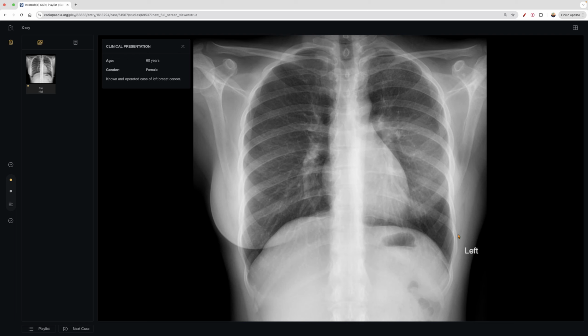We get so caught up looking at the lungs and looking for what we want to look for, our confirmation bias, that we do miss this. And then had you not paid attention to that, or if these people didn't give us the greatest indication here to let us know that there's breast cancer, we wouldn't be able to appreciate the fact that this opacification is actually normal and not an atypical pneumonia or some kind of other hazy opacification.